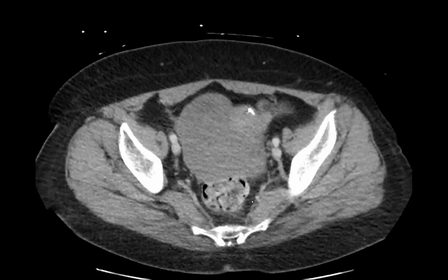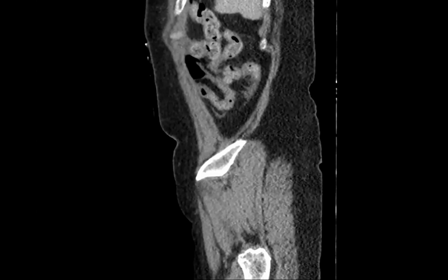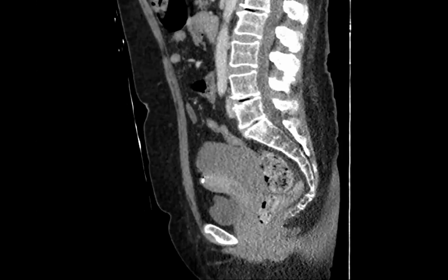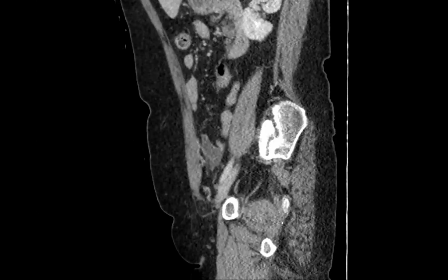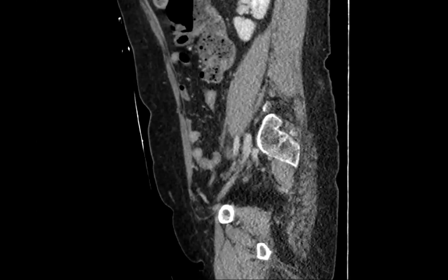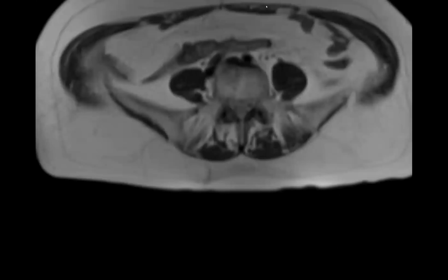Can I see the sagittal? Is it a second moiety? Okay, here's the sag. So there's the uterus, and that's the thing. Some ovarian lesion? So that's what we thought. We said it's very retrouterine. It's okay. So yeah, we did an MR.